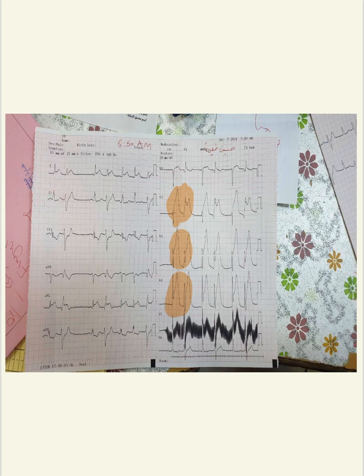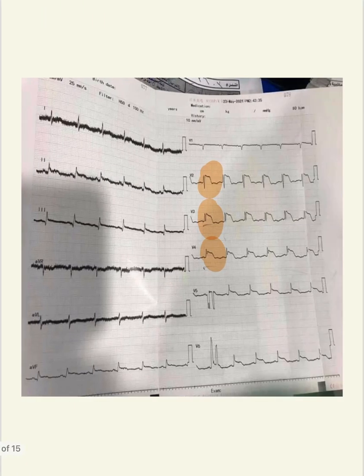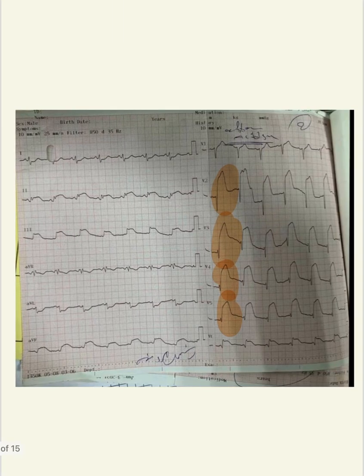الريسبروكال الميرور، يعني الكهربائية تتجه باتجاه الانتيروسبتال فتكون ST segment elevation، while تبتعد عن الانفيريور وول، لذلك يكون بها depression. هذا ال ST segment depression يسمونه reciprocal، يأكد لي elevation. This is also ST segment elevation, lead 2, lead 3, lead 4 and 5. This is anteroseptal MI. I talk about just anteroseptal MI.